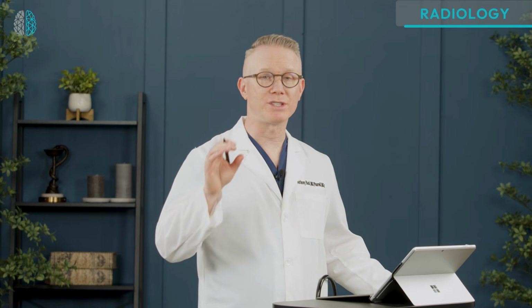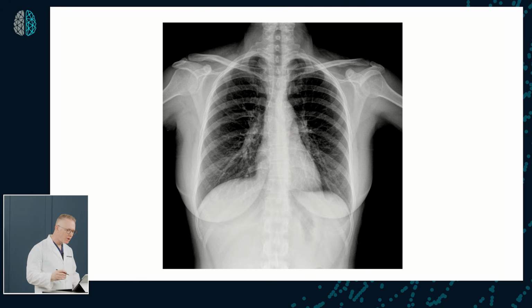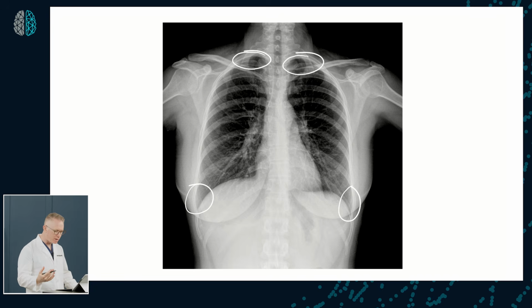So let's now consider the third factor, which is centering of the patient and the overall coverage of the image that you're seeing. We want full coverage. So the lung apices, which are up here, typically above the clavicle, should be visible and above those clavicles. Also, your costophrenic angles should be visible and included.